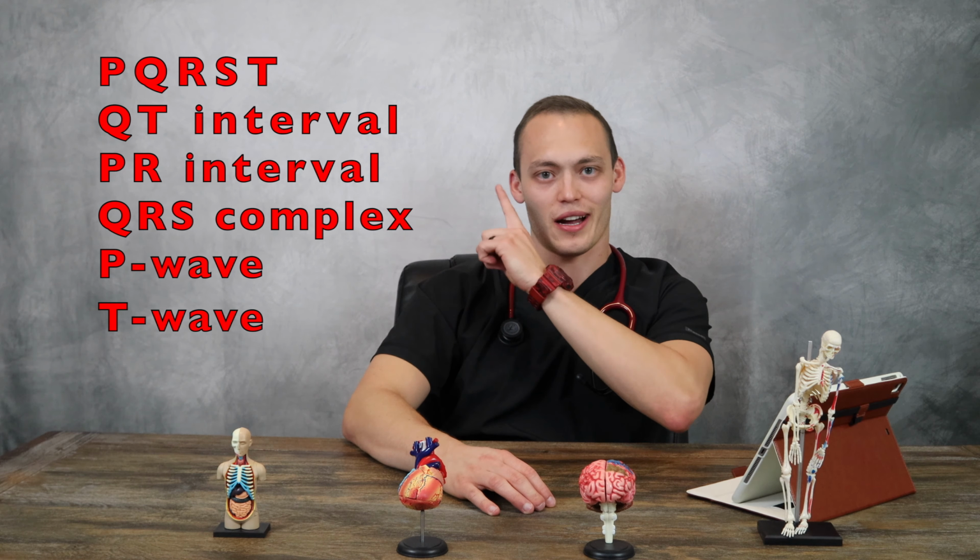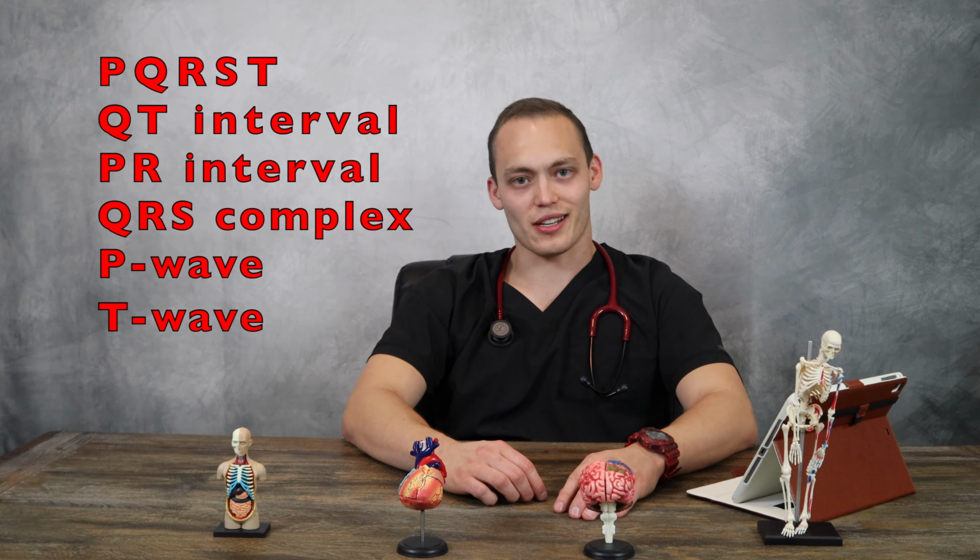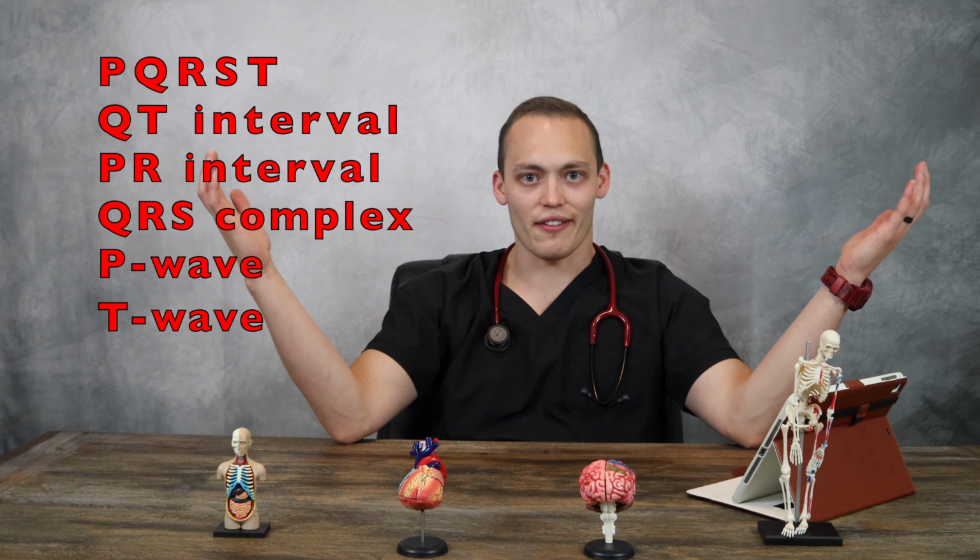As promised, in this video, we're going to be talking about all this stuff right up in here. The PQRST, QT interval, PR interval, QRS complex, P wave, T wave, all that fun jazz. So make sure you stick around. Let's do this.